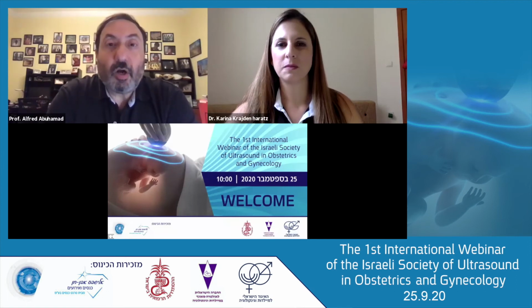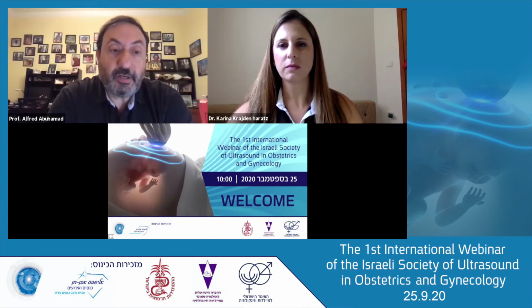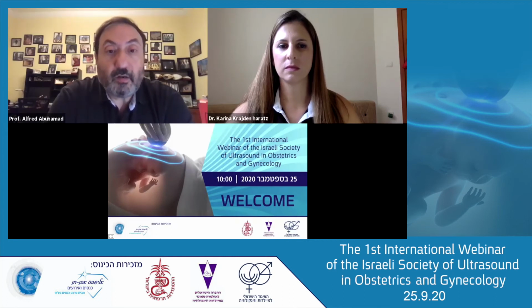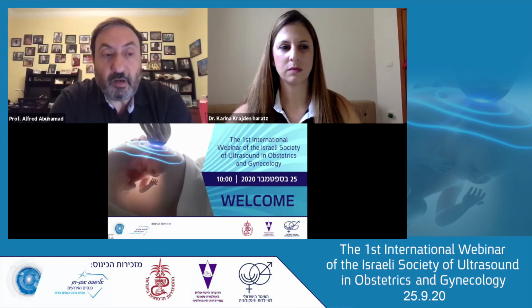Yes. So I strongly recommend that you use color Doppler very liberally in your evaluation of the fetal heart. It is really extremely helpful. The heart is a dynamic organ that is really based on the flow of blood from one chamber to the other and one chamber to an outflow tract. So we use color Doppler always on every single ultrasound that we do, whether it's basic or doing a fetal echo in the evaluation of the fetal heart. I strongly recommend to do so.